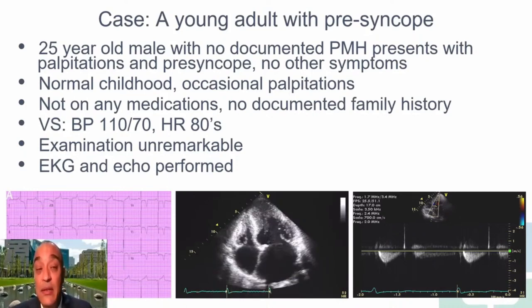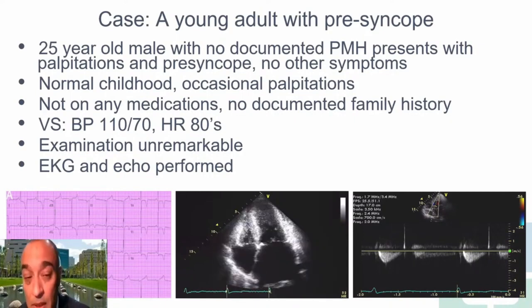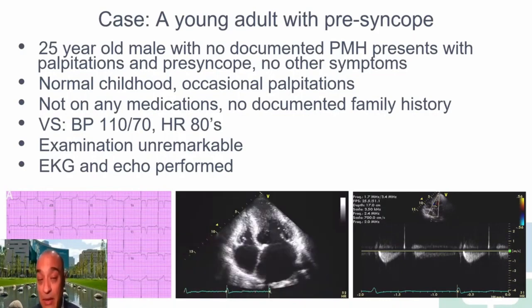Examination was essentially otherwise unremarkable, but if you look at the EKG, given his pre-syncope, the first thing obviously that was done was an EKG, which is markedly abnormal with significant LVH and deep T-wave inversions, especially in the lateral leads. The middle panel confirms what we think would be going on, and there's a massive case of LV hypertrophy, mostly in the apex.